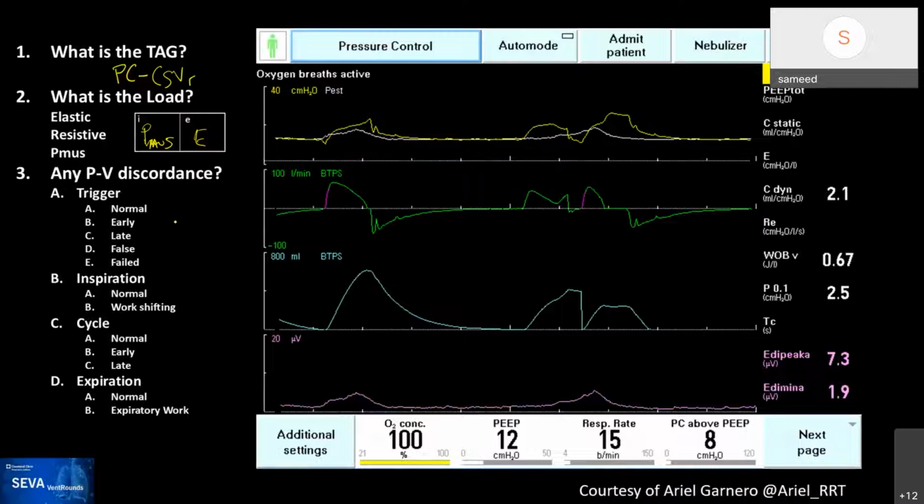So for the second breath, I would say early triggering, just because there's no effort and then it's a trigger that happened. For the first one, I think it's pretty congruent. I wouldn't say that the first one is early, but the second one definitely has an early trigger.